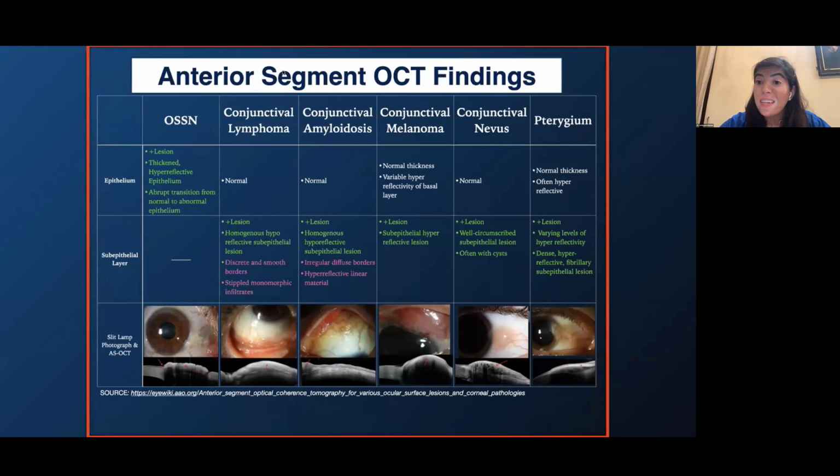One of the questions was conjunctival melanoma versus conjunctival nevus, and that's a great question. Unlike melanomas, conjunctival nevi will have cysts, telltale of their chronicity. These cysts are generally in the subepithelial space, yes. However, for children, many times you may see these cysts in the junction as well.